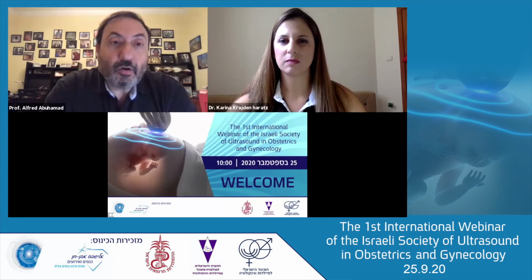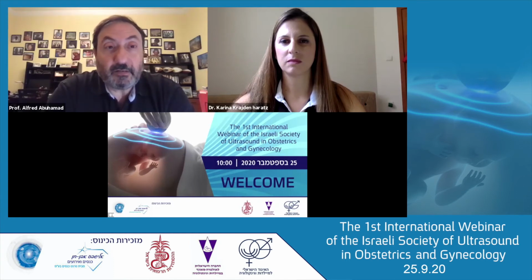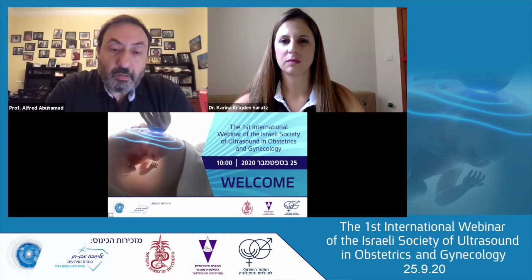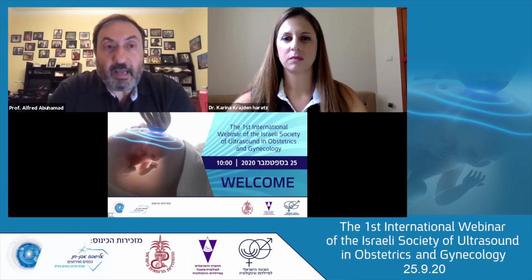So what I look for in coarctation of the aorta, certainly it is suspected by discrepancy in the ventricular system, and the left ventricle being smaller than the right. I look at the aortic isthmus. If the aortic isthmus is small and there's reverse flow, or if it's small with forward flow, then I'm suspicious of the presence of coarctation. I look at the aortic arch. If I can get a clear view of the aortic arch and demonstrate a narrowing at the aortic arch, I can then make the diagnosis of coarctation, but always with a statement that says that this diagnosis is associated with fairly high false positive and negative rates.